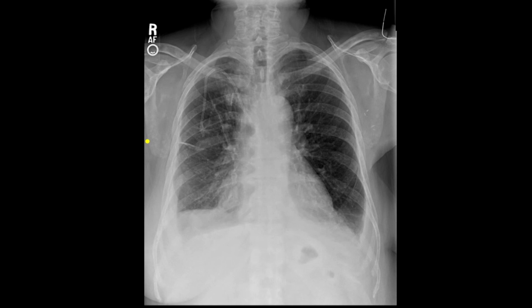So it's important to be able to spot if the patient has had breast surgery, and you can also appreciate once someone has had a mastectomy that the lung field on that side looks a little bit more lucent, because obviously you don't have so much overlying soft tissue, and so that's why this looks a little bit more lucent.